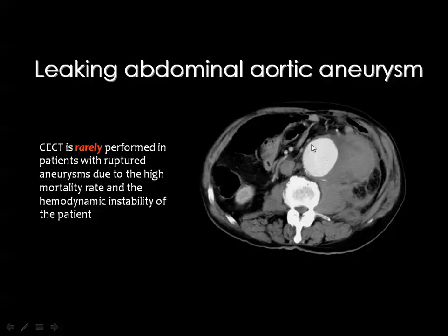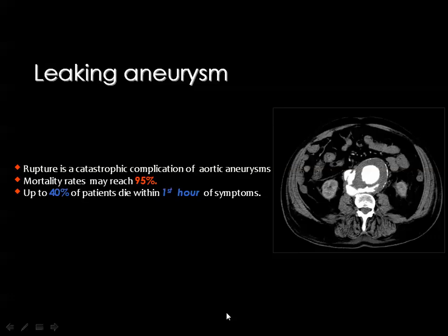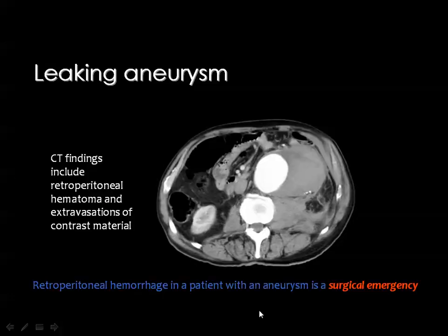And here you can see this is the aorta, which is aneurysmally dilated, and you see a huge area around the aorta representing the leaking aneurysm. And in this case, you can also see this is the aneurysm of the aorta, and this is the leakage around the aorta. This is the patent lumen, and this is a thrombosis within the aneurysm of the aorta, and you can easily appreciate the site of leakage.